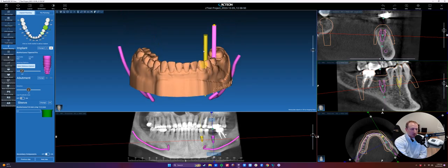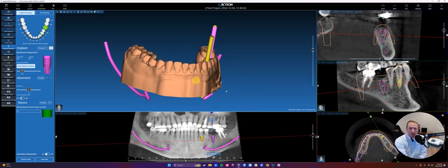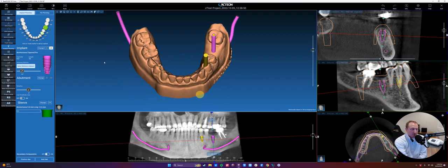Our last video is going to be on the Reports and Exports tab, and we're going to showcase kind of what kind of things we can export from the software to help us on the day of surgery. Okay?